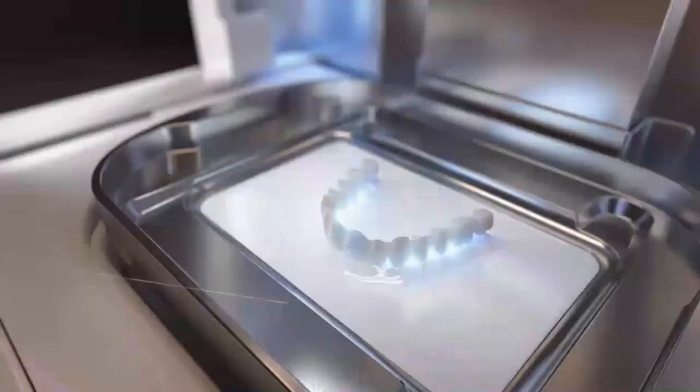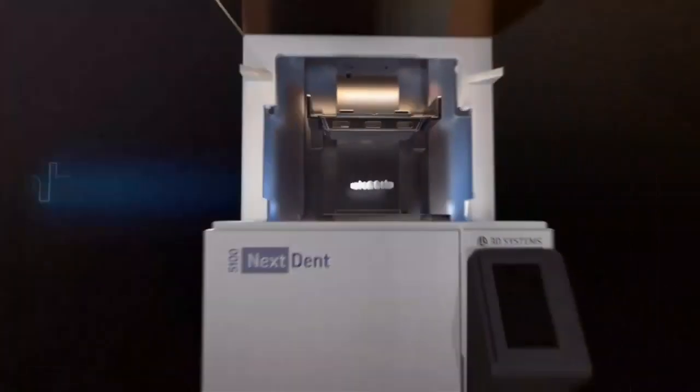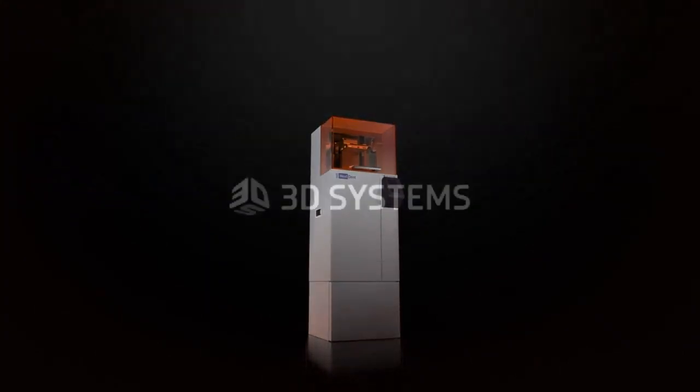During this webinar, we will show you the most important new functions that are applicable for our NextDent 5100 users. We will cover some software functions, build and support style changes, and of course, the new main features of this release. All these developed specially for our customers to improve the daily workflows and increase production on your NextDent 5100.